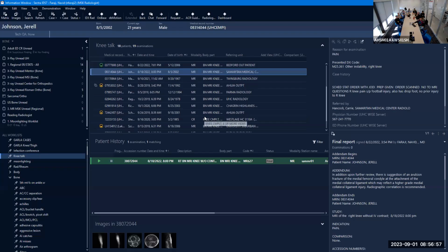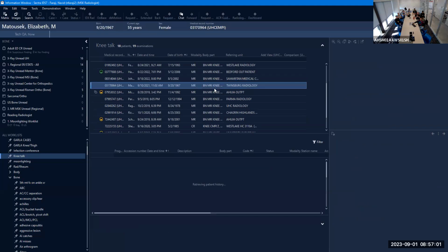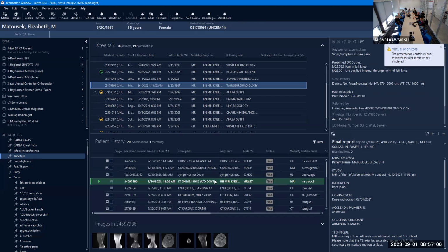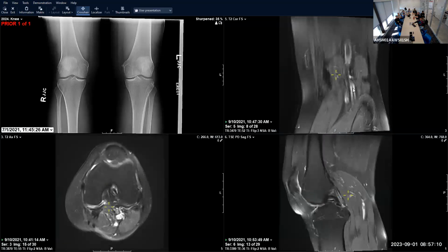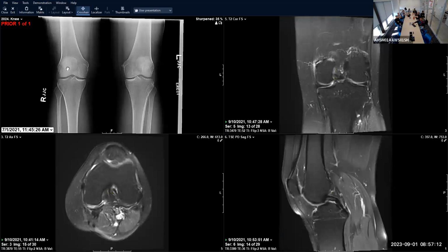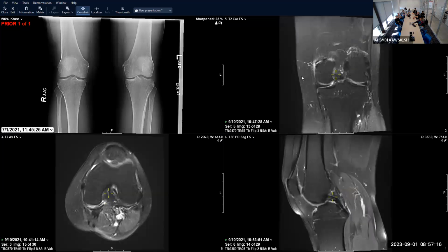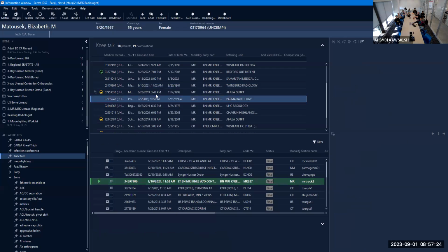Okay, almost time. We've got some more cases, but we'll just do what we can. Any pathology anybody has trouble differentiating? Okay, this is just another one of my favorites. Hydroxyapatite deposition, medial gastroc origin, just to prove to you that it happens to more than one person. We already looked at that guy.